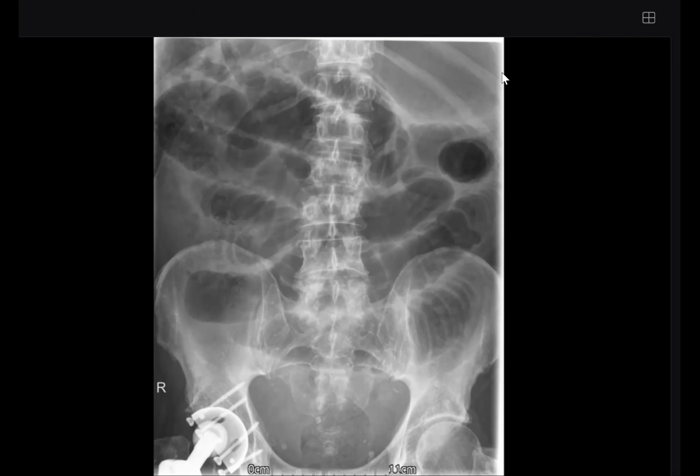How to confirm? An upper abdominal radiograph is needed to include the lower chest in erect position. Sir, I would like to request an upper abdominal radiograph to include the diaphragm to look for subdiaphragmatic air. I cannot appreciate any metallic densities to suggest the presence of surgical staples.